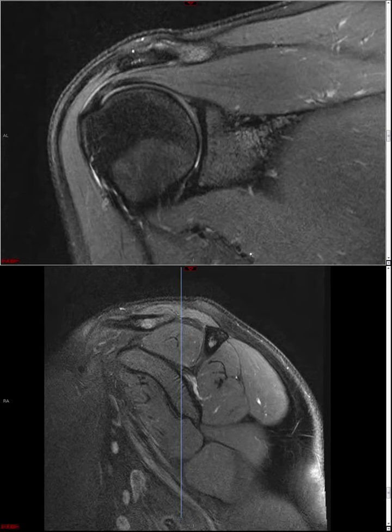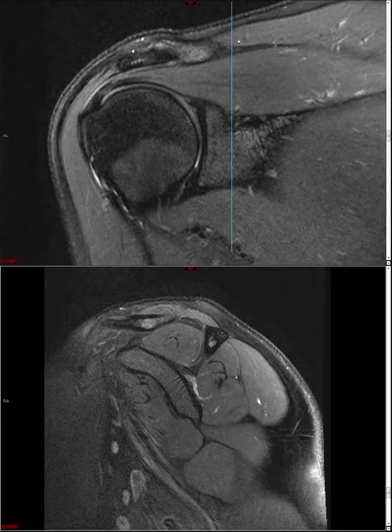Then you can see that this sagittal cuts through around here on the coronal. Since the whole muscle and tendon junction and tendon are retracted proximally, your sagittal image here might actually be cutting through the distal muscle belly, and so it may not fill the supraspinous fossa completely, and so you may erroneously call atrophy of the supraspinatus muscle when in fact it's just markedly retracted.